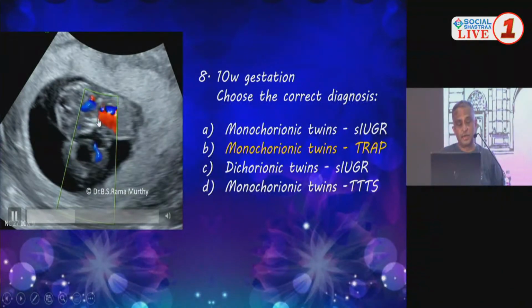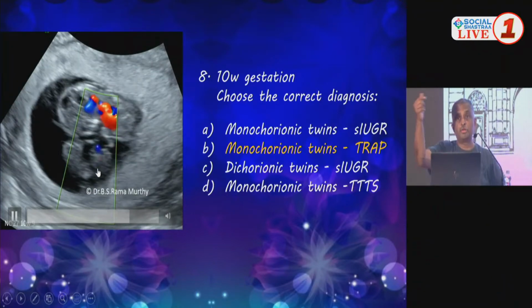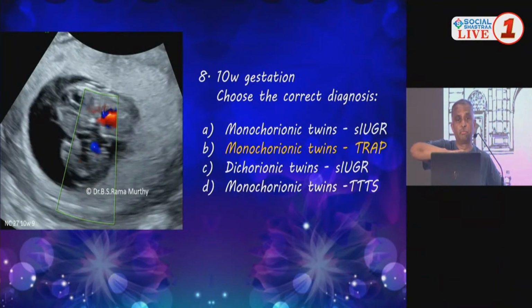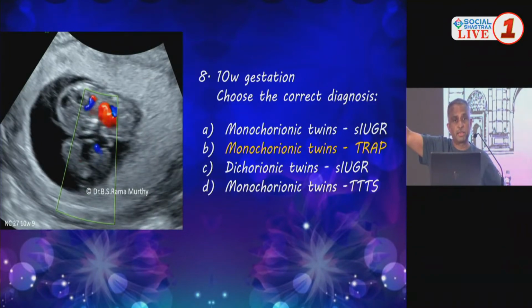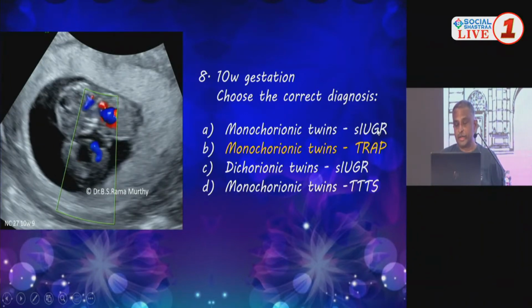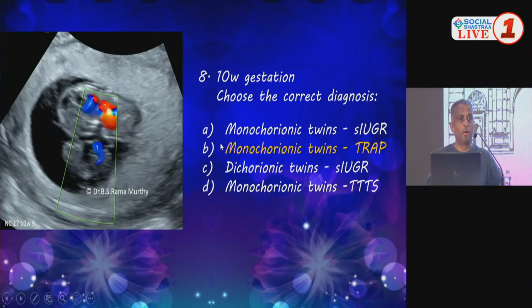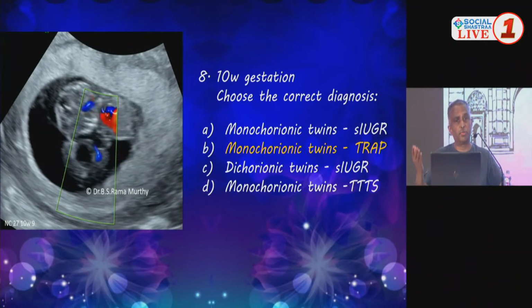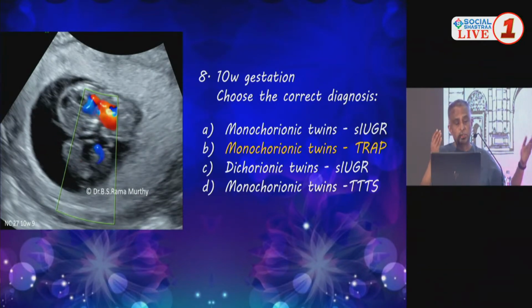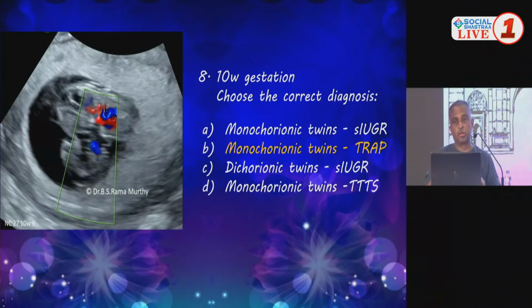That means it is obtaining blood from the placenta into the fetus, whereas the normal umbilical artery carries blood from the fetus into the placenta. So this is twin reversed arterial perfusion, otherwise called a parabiotic twin, an acardiac, acephalic monster. This is one of the earliest cases that I had in my collection. I thought this would be interesting.